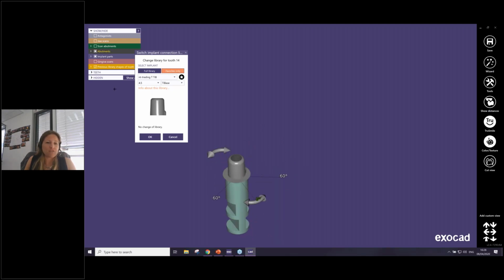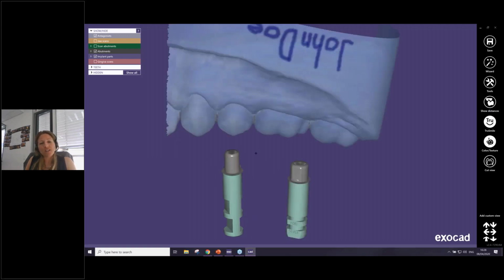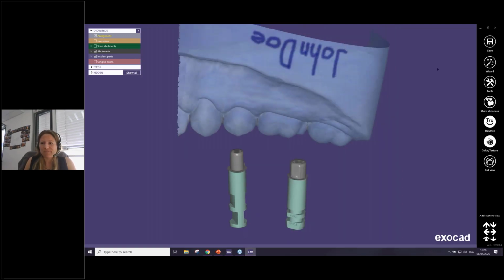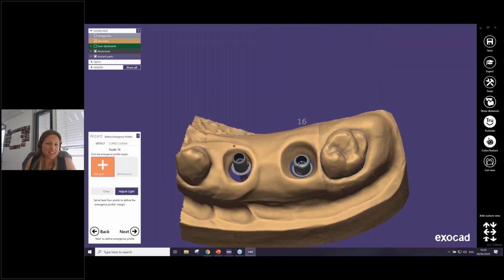And in this case, for example, maybe you realize that's not the right size. I have chosen 4.5, but in reality I have a 3.8, and I can switch it. In this library, it's allowed. So I have chosen the 3.8, okay, and then I can continue. That's new in Plovdiv.